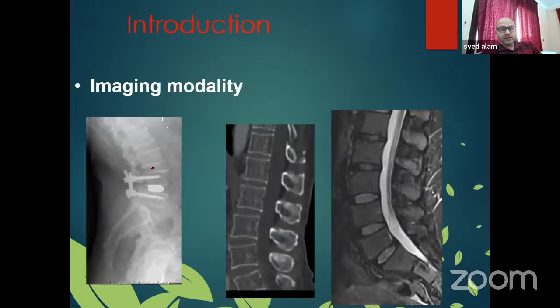X-ray is still good. CT scan and MRI are the methods of choice, but we should not neglect X-rays and CT scan. For fractures, CT scan is still fantastic. X-ray is still useful in follow-up cases, post-op cases and alignment cases. We should not neglect any modality, because X-rays cost nothing and are sometimes very helpful. CT is still the best for fracture classification.